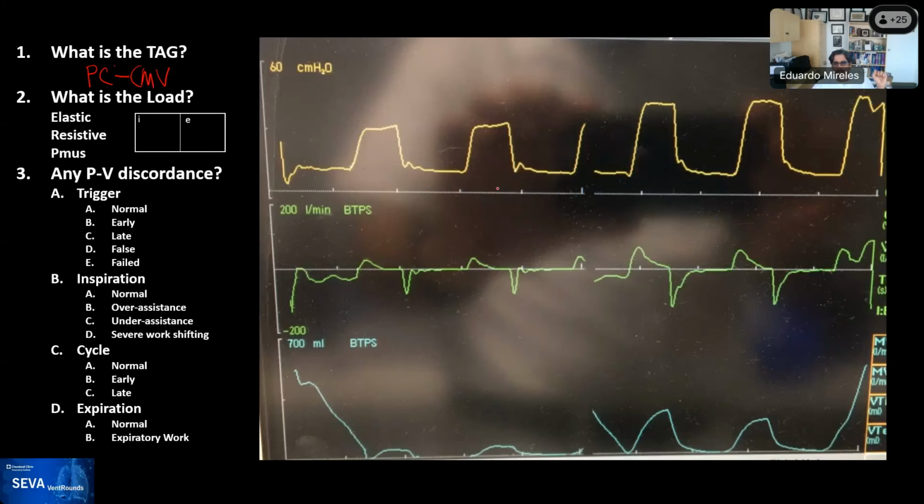And then several of you recognized a typical feature when seeing this. If you're controlling pressure, you would expect, if this was a set point, that all the pressures would remain at the same height regardless of the tidal volume delivered. However, here you can see that there's a breath at one height. The next one is a little bit higher.